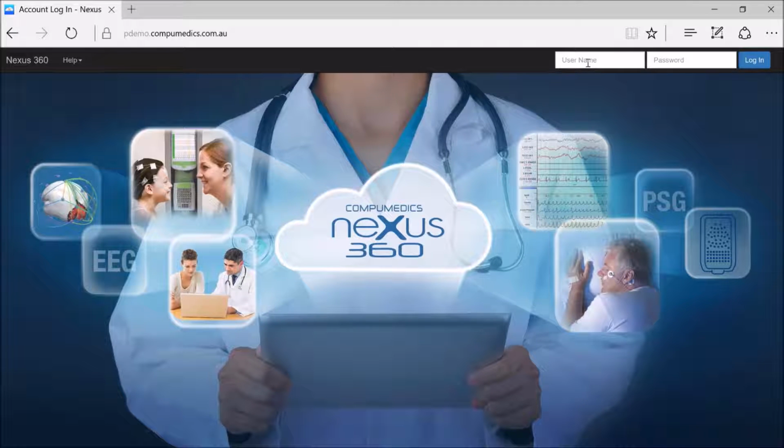Hi everyone, welcome to today's tutorial on setting group permissions in Nexus 360 and adding and configuring user accounts. I'm going to log in as an administrator.